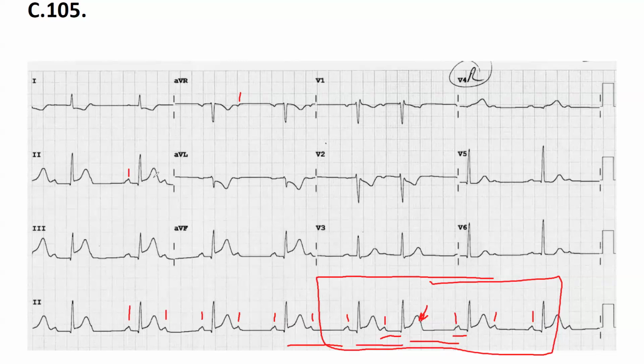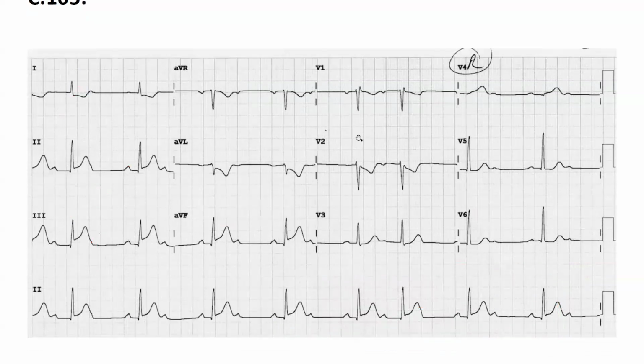Axis. The first lead is positive, aVF is positive, so it's in the normal deviation. Lead 2 is more positive than lead 3, so it's around 60 degrees, around 70, because lead 1 is smaller than lead 3. Okay, that's 70. Now, the ST segment is elevated, but we haven't touched ischemic heart diseases yet. That's an inferior MI, but next time we will deal with it. Did you say it was type 1 or type 2 Mobitz? Type 1.